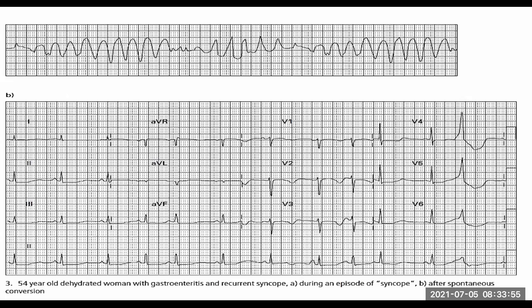All right. The next zone we'll look at is the septum. All right. So V1 and V2 are what we call the septal leads. All right. So they look at the septum. So what do we see in V1 and V2? Anything that's abnormal or anything that's strange? Not much. Again, maybe just the T waves. So this is an RS, right? So when you have your first upward deflection is called an R, then your downward deflection is called an S, right? That follows. So RS is quite normal. You're supposed to have that in V1 and V2, right?